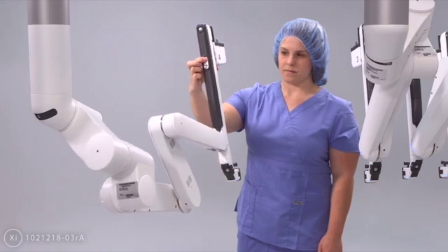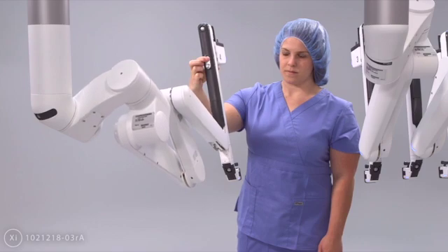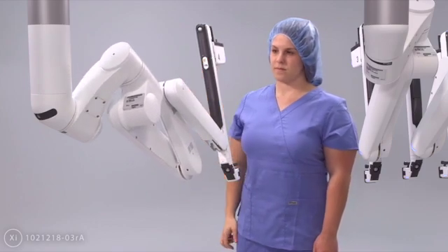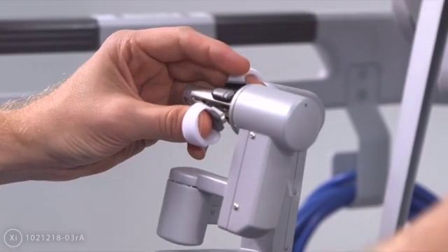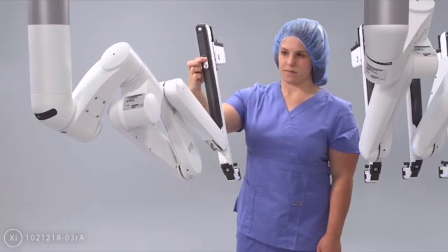Activating these buttons does not move the remote center or instrument tip position and therefore allows intraoperative adjustments. These buttons can be activated if the surgeon is actively controlling the arm, but surgeon control will be interrupted and paused until the adjustment is complete.